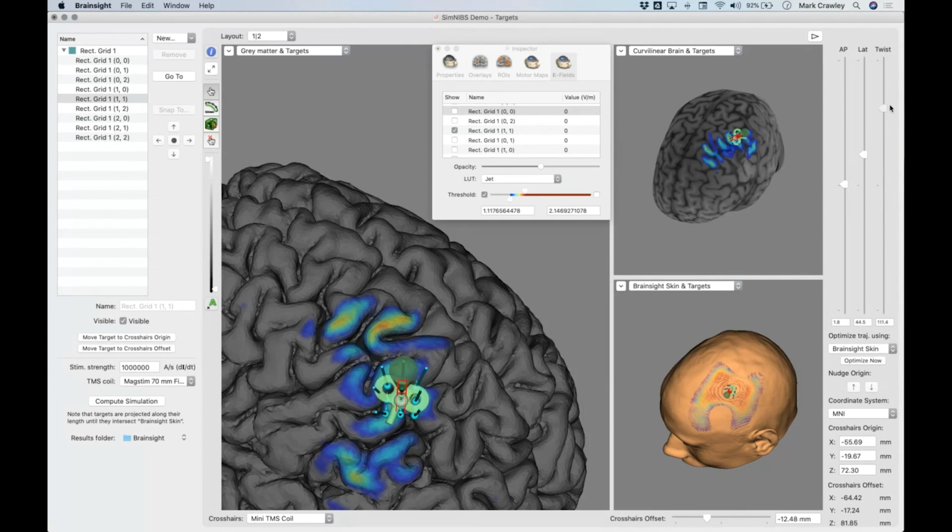So it does take it into account. And if you've used SimNIBS as well, on its own outside of Brainsight, you'll see that there's a certain view you can do in SimNIBS, which gives you directional vectors for which way the current is traveling across a structure. So yeah, it does take it into account. And obviously it's very important.